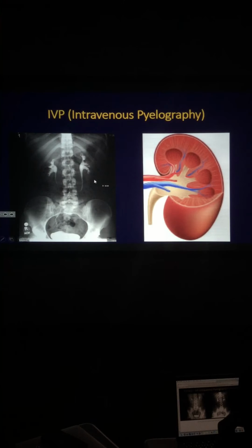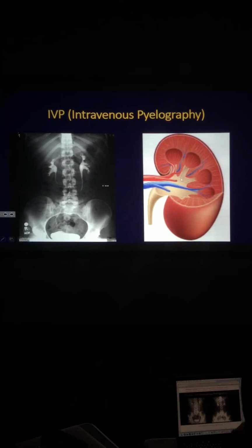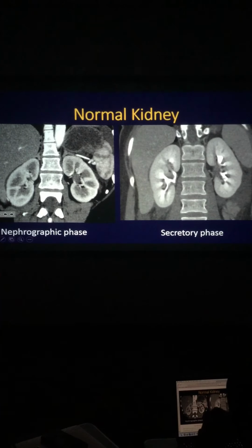You know, the kidney constitutes, you can say, the periphery of the kidney is the cortex of the kidney, and the lucent area of the kidney is called pyramids. And these are the pelvic calyceal system. And in CT scan, it looks like this. There's a bean-shaped structure here, clearly seen, beautifully demonstrating the renal cortex and the low attenuated area, the pyramids, and you can see here adrenal sitting like a cap at the top of both kidneys, right?